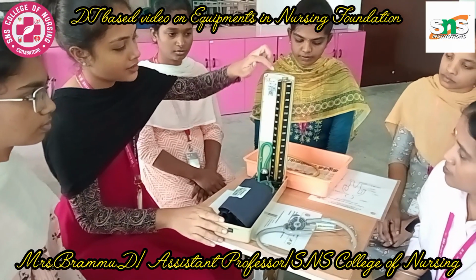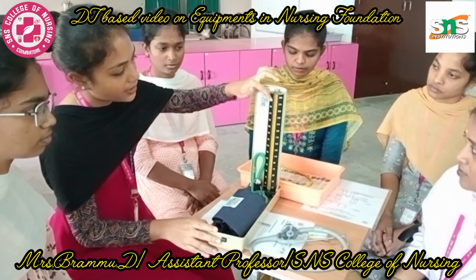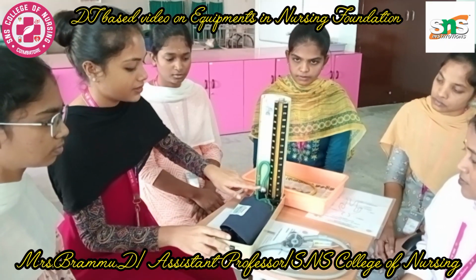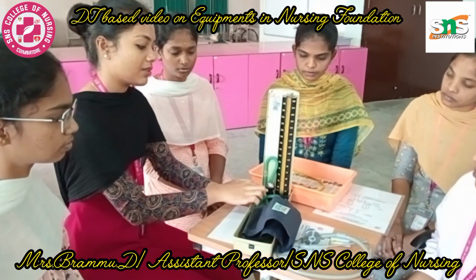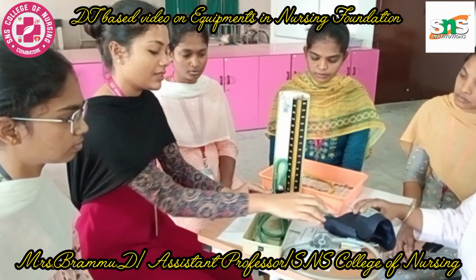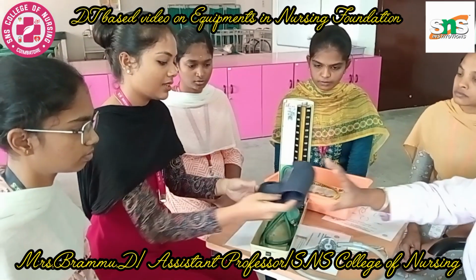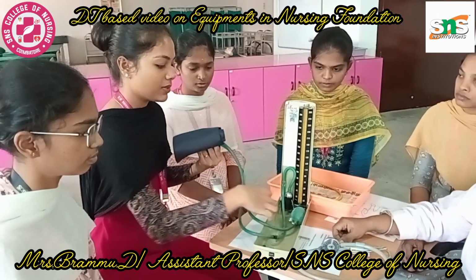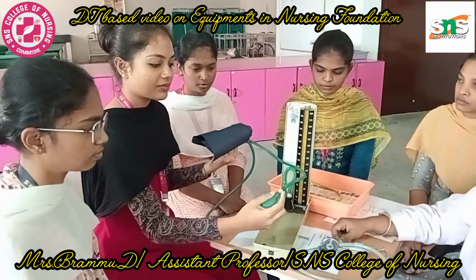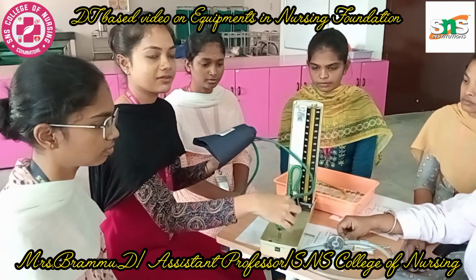In the center is a glass tube, and inside the glass tube we can see mercury, and this part is called the reservoir. Inside the metal case we can see the cuff, which is tied around the patient's hand, and these are the tubings, and here the inflation and adjusting knob is present.